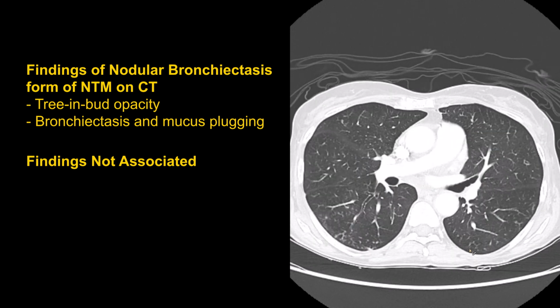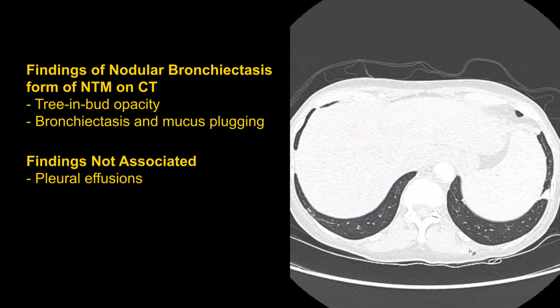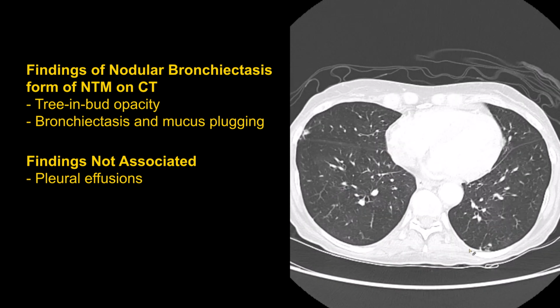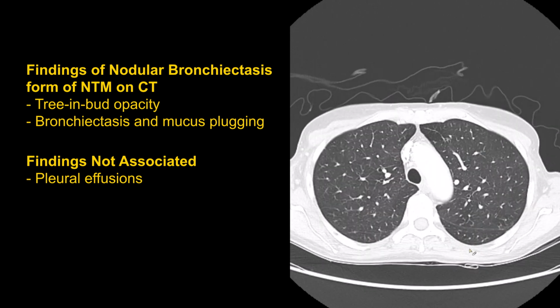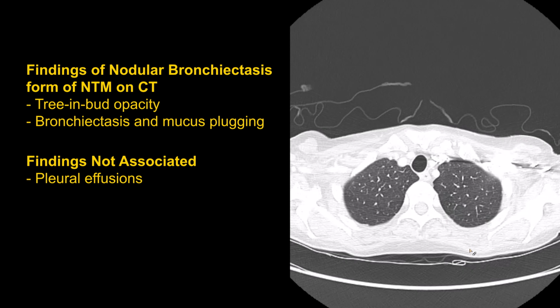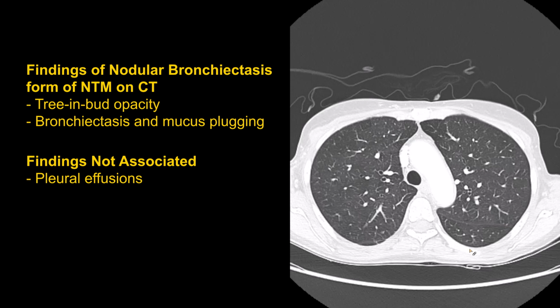So notice some things that we don't see here. One is we don't have pleural effusions. Okay, nontuberculous mycobacterium is typically not associated with pleural effusions. So if you see pleural effusions, you need to think about a superimposed process or a different disease altogether.